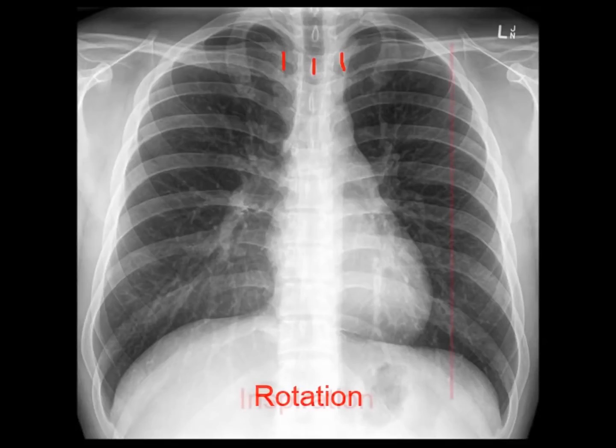Next, check for adequate inspiration by looking at the midclavicular line and seeing which anterior rib intersects the diaphragm at this point. It should normally be the 5th, 6th, or 7th. More ribs means the lungs are hyperinflated, often seen in COPD. Less means that the patient may not have taken in a full breath when the X-ray was taken.